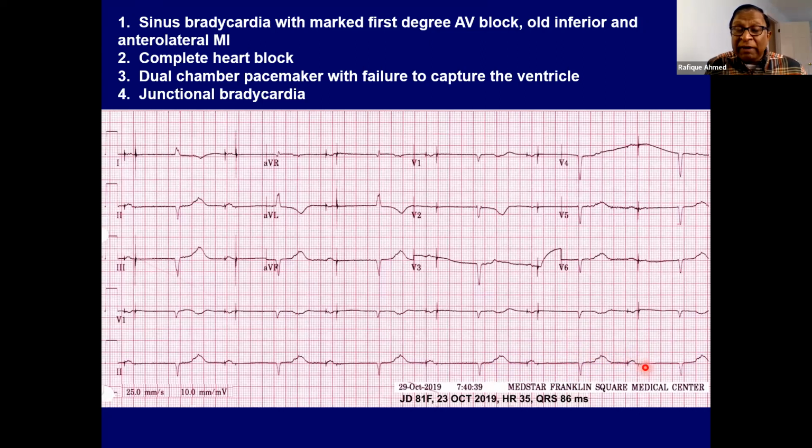If this pacemaker is set at 60 beats per minute, the R wave triggers the next cycle and calculates that the ventricular pacing should be here and then preceded by the atrial pacing. So this is a ventricular timed rhythm. And there are other types of pacemaker which do both, or atrial timed, depending on the manufacturer. So that's why the timing is like this, that it is pacing AV.